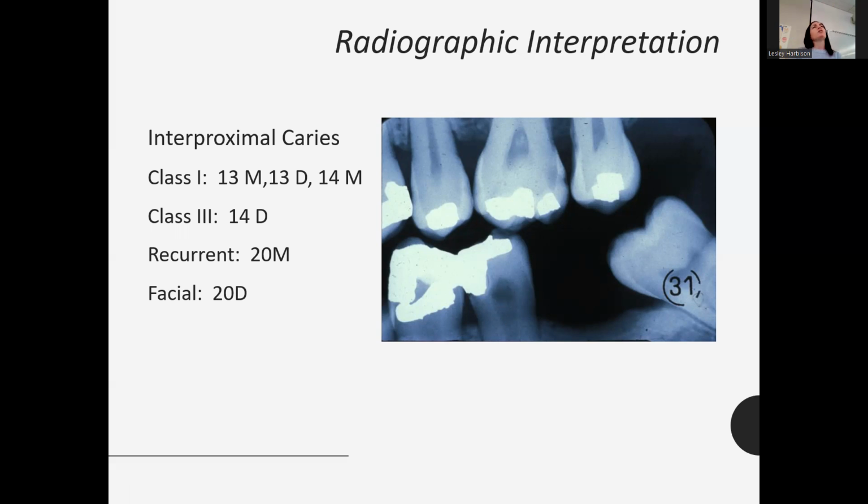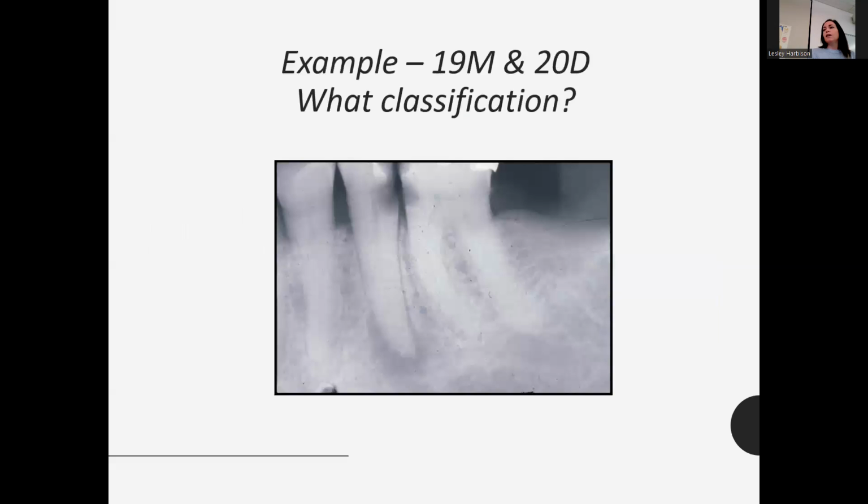So I don't know if that would really be a class 5. You don't really know until you see it. Exactly. Some of this stuff, you just don't see everything that you can do to make a definitive diagnosis until you see it clinically and radiographically. You just have to have both.